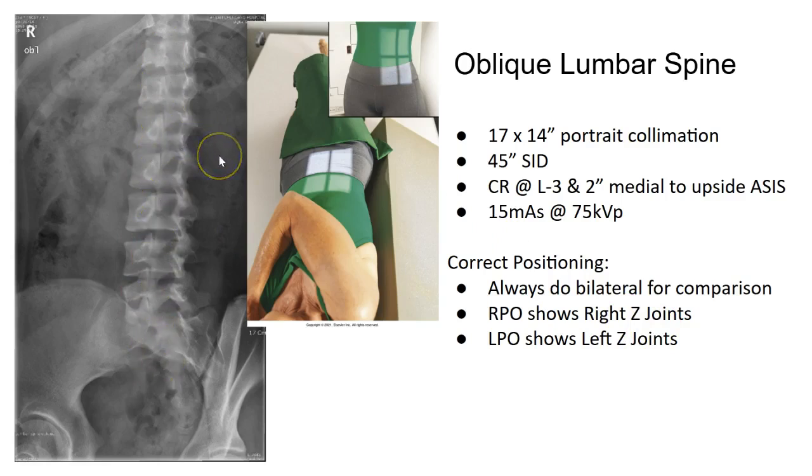So I'm gonna trace a Scotty dog for you. So here is the ear of one dog, the nose, and then the front leg. Okay, I don't really care about the back half. I want you to focus on the front half of the Scotty dog. Here is the eye. Remember, the eye is the pedicle.